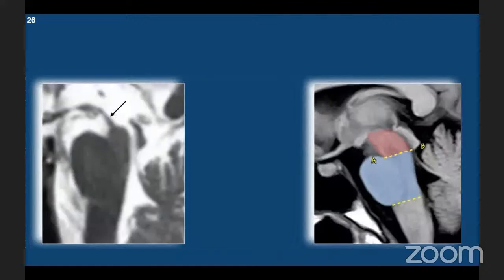The image on the left is a sagittal T2 of a patient of progressive supranuclear palsy or Steele-Richardson syndrome. This patient presented with downward gaze palsy, dementia, and bumping into objects and people. The image on the right side is showing the normal ratio of the midbrain and pons. But the image on the left is showing the marked atrophy of the cerebral peduncles and the tegmentum. The pons appears normal.